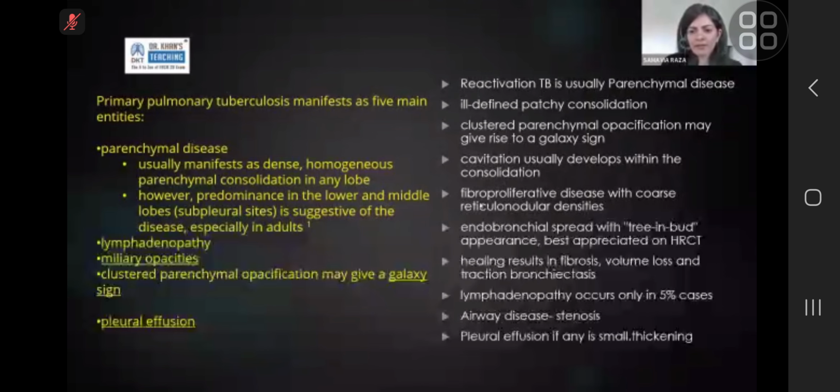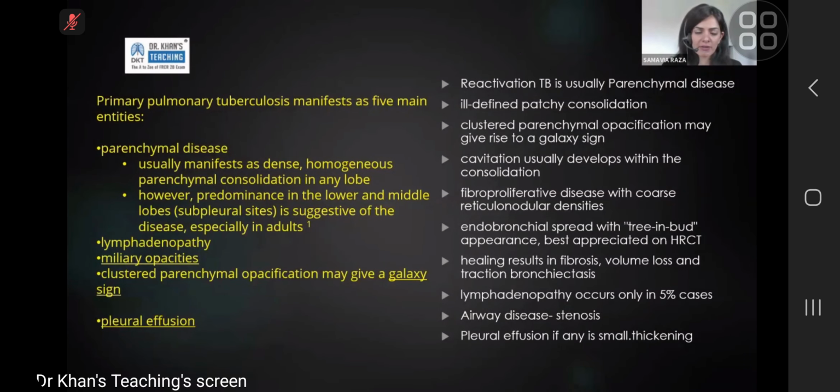Yes, absolutely correct. So those three are the ones you're looking for: renal, choriocarcinoma, thyroid. Prostate, not so much. Pancreas can be, again, not so much. The miliary pattern is very specific for tuberculosis in the right patient. If it's a slightly older patient, somebody who may have weight loss and known malignancy elsewhere, the differential becomes more important. But in a young patient, miliary changes in the lungs are very suspicious for tuberculosis.